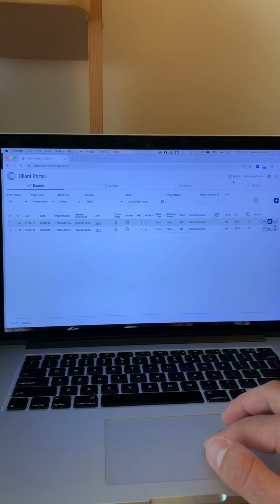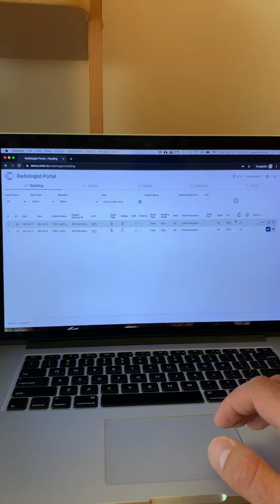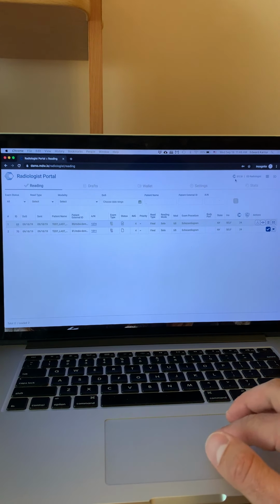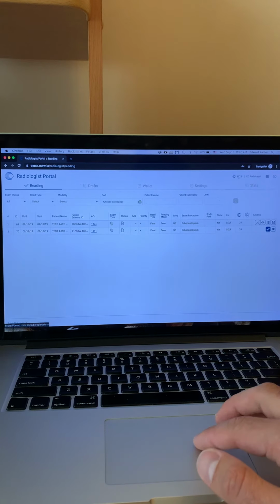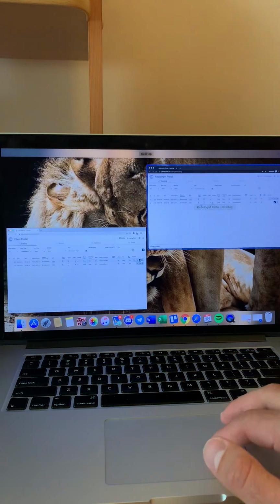And notice that wallet information will change once again. We had 2652 here, and we had 312 here. Now, because the study has been read, both accounts will be updated. This will be plus, this will be minus, and the deal, as we call it, the smart contract, has been completed.